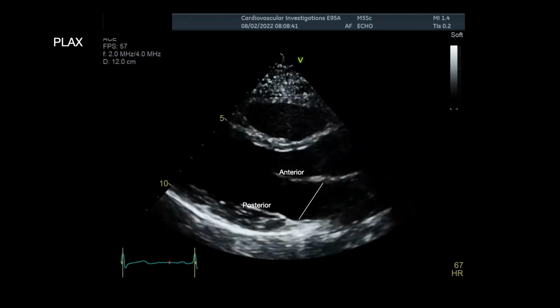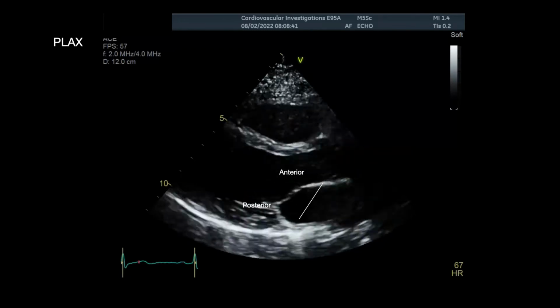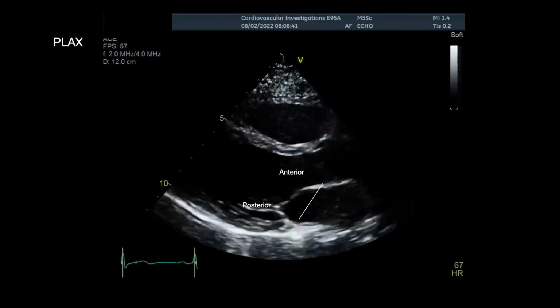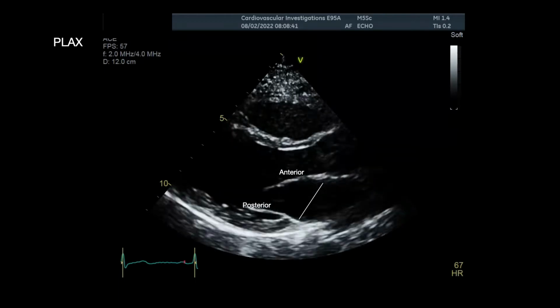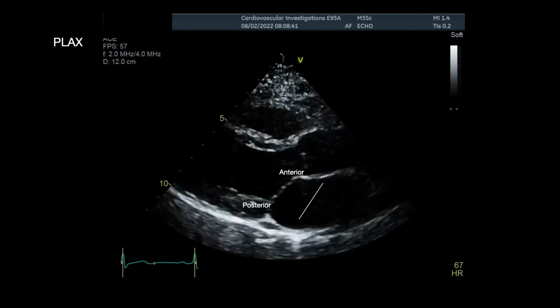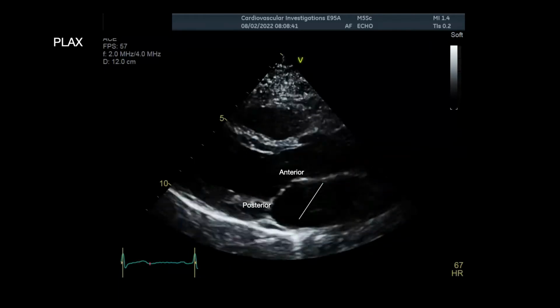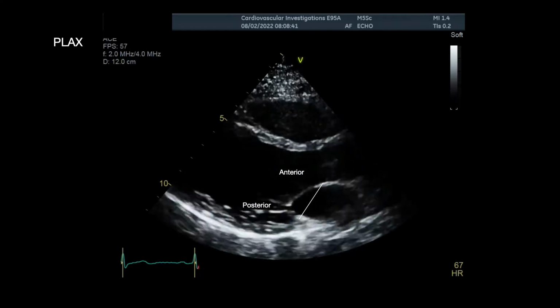You just need to look at enough echoes and you'll be able to tell a normal thin leaflet as compared to an abnormal leaflet. The leaflet should be freely mobile on the ventricular side of the mitral valve annulus and should not cross the plane of the mitral annulus on the atrial side. It's a bit tricky in a moving image, but you can see the white line I've placed on top of the loop, which approximates the mitral valve annulus. No part of the leaflet should be prolapsing back into the atrium beyond that line.